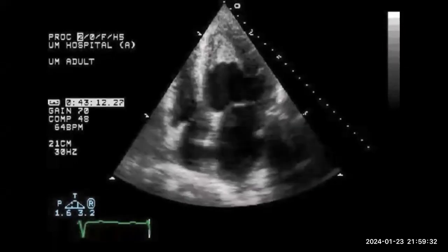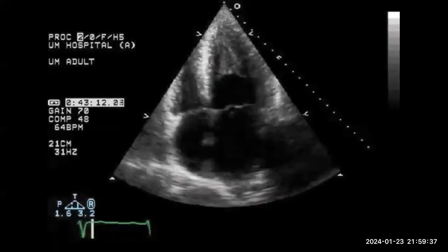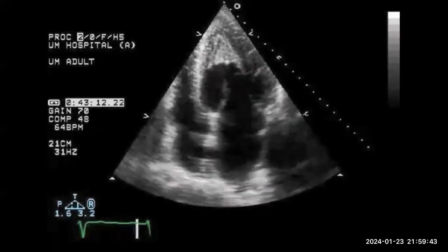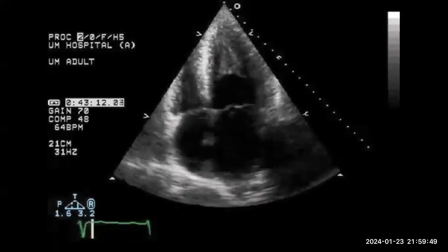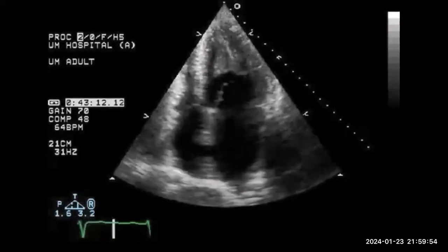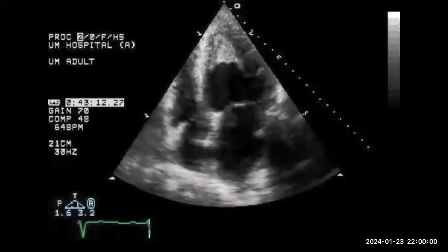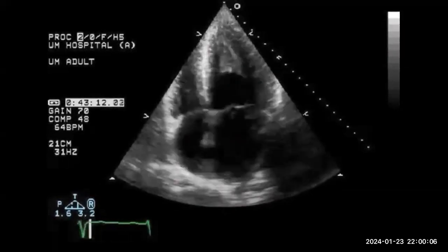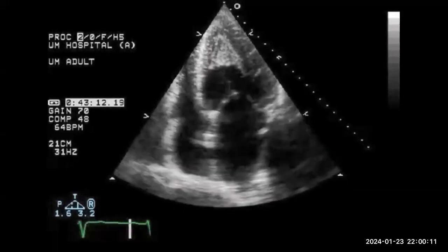So whenever there is narrowing, suspicious of a mass, the LV apex looks like this. So the 3 differential diagnoses will be, number 1, as all of you mentioned, hypereosinophilic or Loeffler syndrome. The second one is apical HOCM, and the third one, what is it? The thrombus, we said? No, it's not a thrombus, it is non-compaction. Sometimes non-compaction can also have a thrombus in between the crypts. So you need to look for other views and you need a contrast study to differentiate between them.